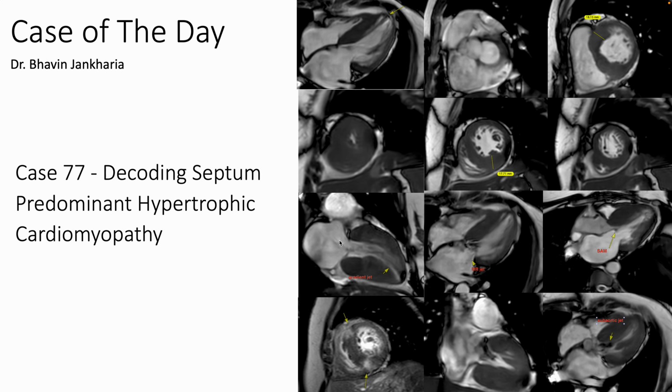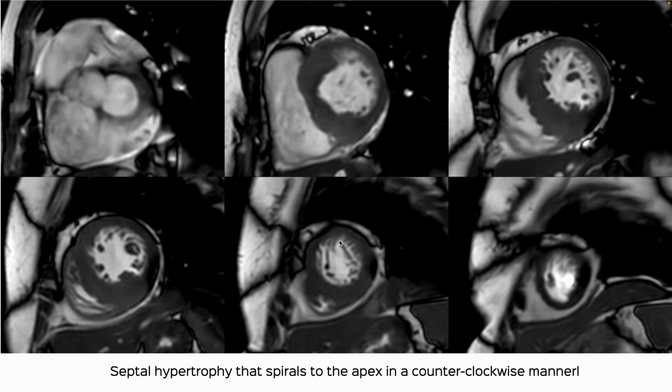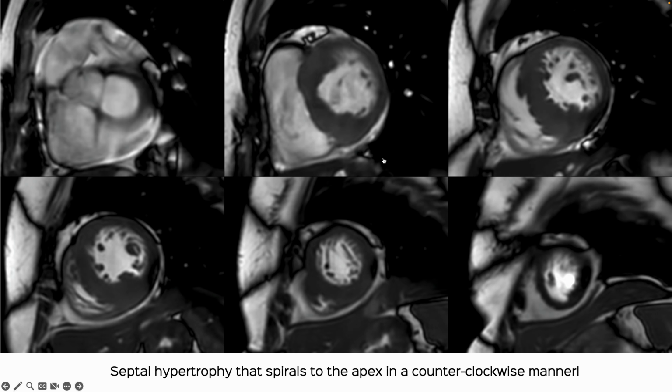We have our 77th case, and that's titled Decoding Septum Predominant Hypertrophic Cardiomyopathy. So, this 56-year-old was found to have HCM on echo, came for a cardiac MR, and we'll just run through all the various things we have to do.